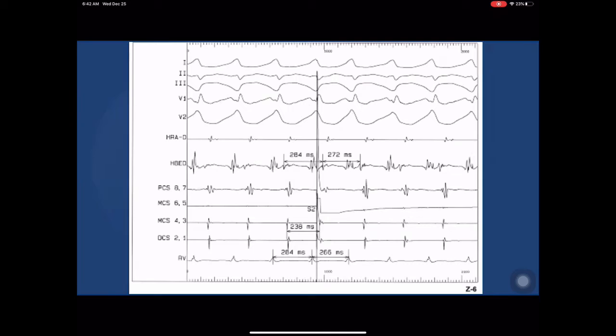This rules out VT. So you already know VT is not part of the answer here. That's critically important, and this thing, for all the world, on a 12-lead ECG could mimic VT. And obviously, you know this isn't aberrancy. This doesn't look anything like aberrancy, but still, that's one of the things you'd have to rule out. Now, that gives you a starting point.